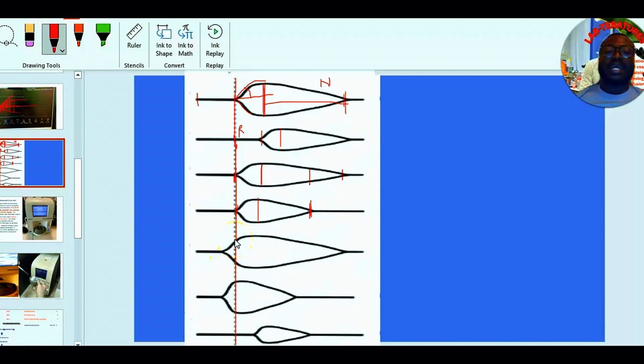People who have their natural anticoagulants ineffective are unable to stop the coagulation to maintain hemostasis, and therefore they have their system exposed to this kind of graph. So this is what we mean. For instance, people who have factor V Leiden, their factor V is able to initiate a clot, but it cannot be reversed because it is mutated. That leads to a very big problem of this kind. So you can interpret it if your graph looks like one of these.